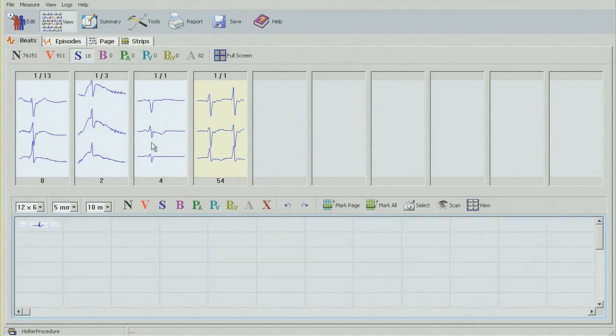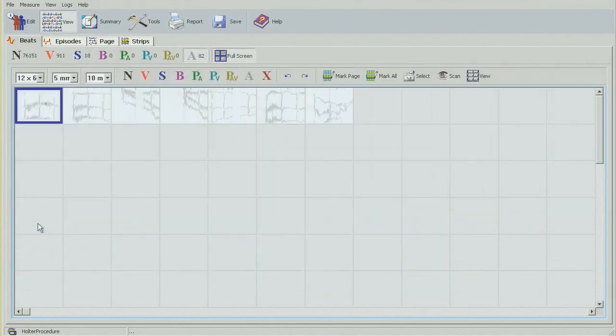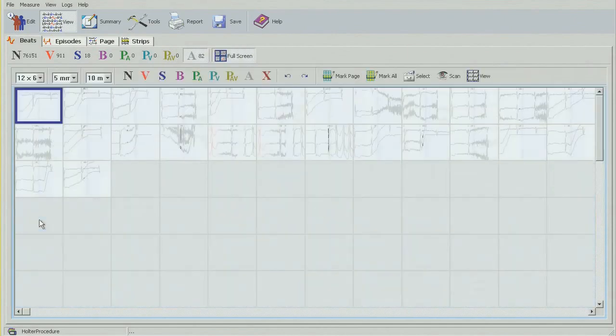So at this point we're done editing our supraventricular beats, and the last thing here I'm going to check are the artifact bins. So again, using the same method. Only 1 character here, I don't need to go here, neither here. Move on to the next one.